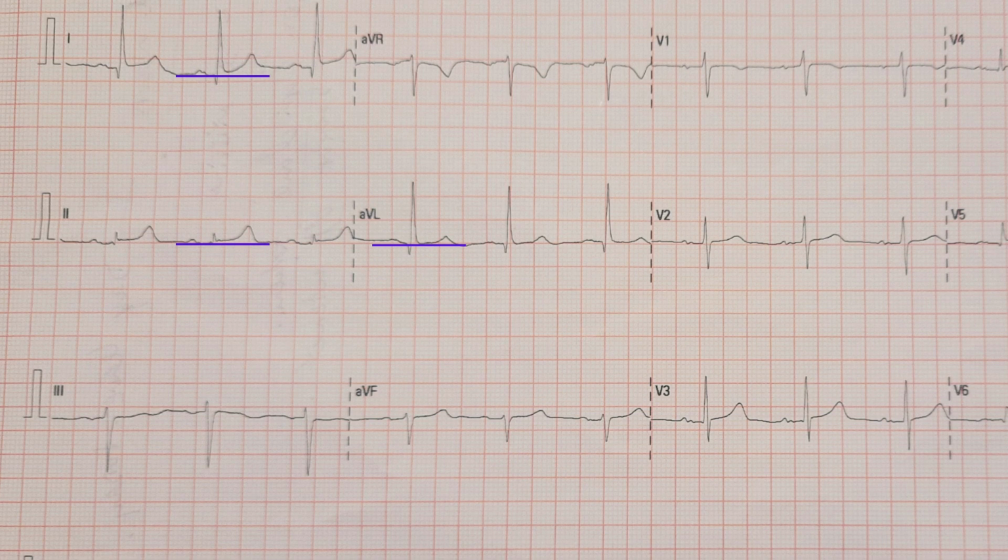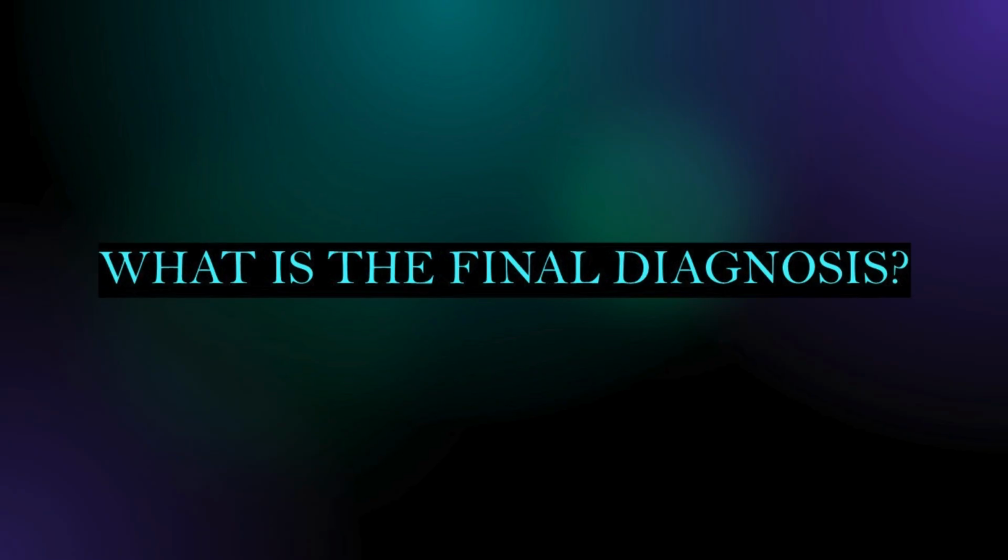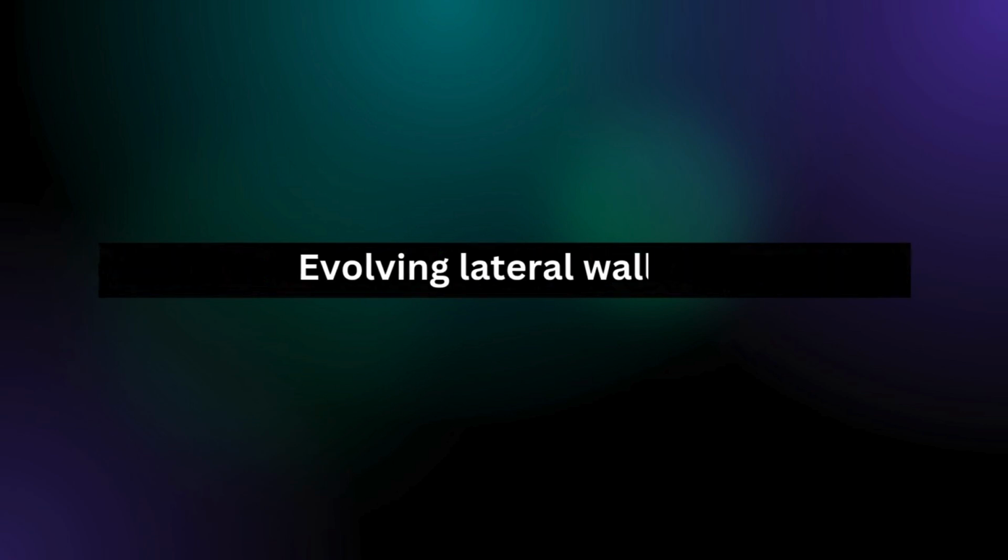So with this definition, our patient does not fulfill the criteria of acute ST elevation MI, but the presenting symptoms and the ECG changes are suggestive of evolving lateral wall MI. She should have serial ECGs and be referred to the cardiologist for further management like primary PCI.